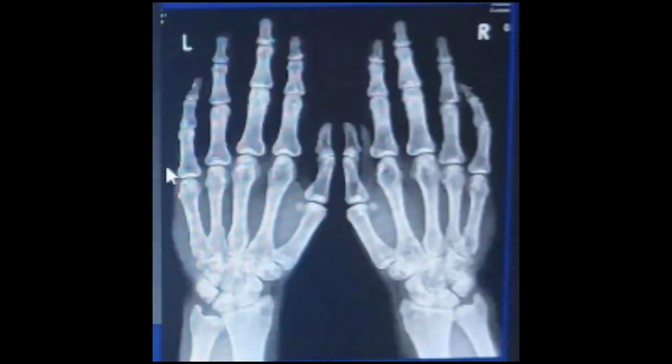On this radiograph, you can appreciate multiple bone islands clustered around the joints, and these are all parallel to the surrounding trabeculae. However, the quality of this film is not very clear, but to some extent you can appreciate small tiny sclerotic bone islands around the joints.